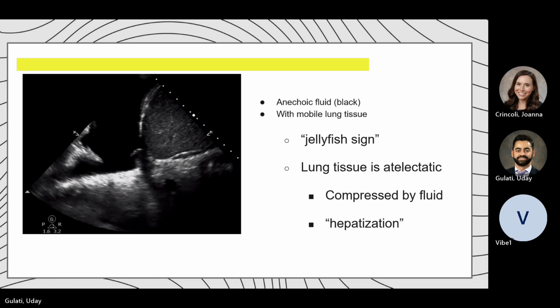This is that classic jellyfish sign. You guys see the jellyfish? That's like a part of your lung just floating in this thing of fluid. Some people call it like plankton, or an octopus sign or a whale sign. Sorry, not a plankton sign, because a plankton sign is something else.